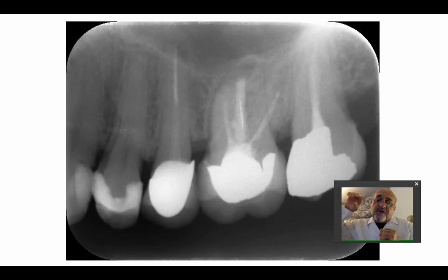You see that when you take an X-ray for the sinus, there is the superimposition of the soft tissues, the teeth, the bone, and there is the meatus, the inferior concha, which spreads over the medial wall of the sinus. Again, it will cast a shadow. So in this case, it doesn't appear radiolucent. It's always grayish in appearance.